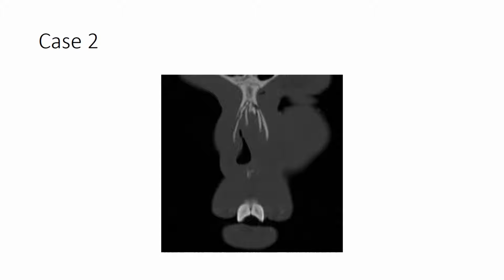Is this bilateral symmetric dental fractures? No, this is just the way the coronal slice is cutting the teeth. Dental trauma wouldn't be bilaterally symmetric, and you still have the enamel. So the only thing you could potentially be missing would be a type 1 dental fracture of just a little bit of enamel, and that is really an insignificant miss anyway.